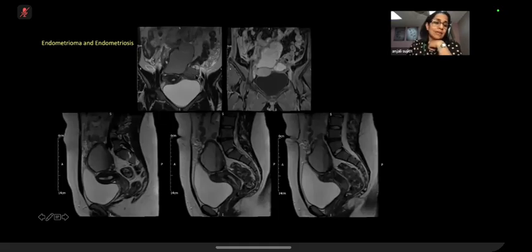So what happens in case of endometriosis or pelvic inflammatory disease is that there are a lot of adhesions happening in the pelvis. So that actually pulls the ovaries or the cysts more towards the midline. And so they are called kissing cysts. Okay, and again we can see the T2 shading here, which is a gradient in the loss of signal. And again we can see the endometriotic plaque, which is not as extensive as in the previous case. We can still see it causing adherence of this endometrioma to the posterior surface of the uterus.